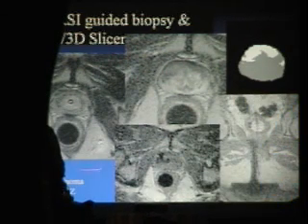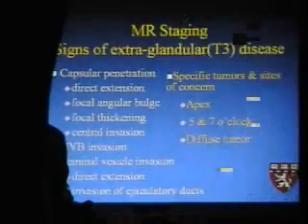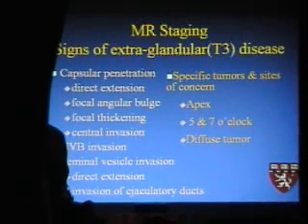And so this is where his adenocarcinoma had either recurred or was residually there from the original therapy. We were then able to re-implant this patient and do what's known as salvage brachytherapy, where you place the seeds back in again, and now we place them all the way up here in an effort to control his tumor locally. So spectroscopy, I think, is showing some major clinical applications.